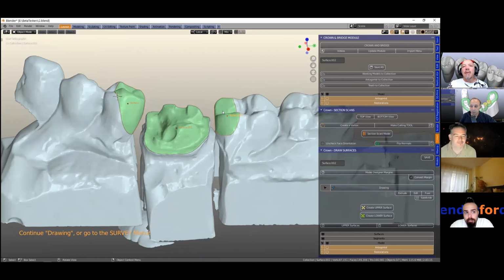Now, we know in a lab, when we make crowns, the contacts are a very finicky and tricky thing. We need them to be exact so that the crown can slot in perfectly. Ultimately, we want a system where we don't need a model. It's model-free: you mill it, you put it in the mouth, and we don't even have to check it on the model. That's my objective, and the only way we can reach that objective is to be very finicky with these contacts.